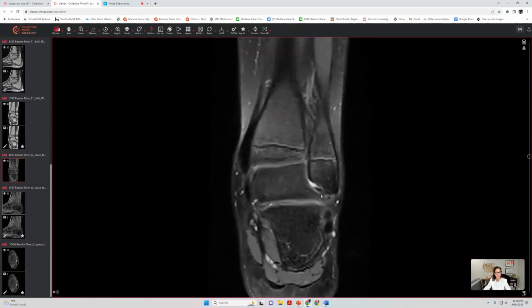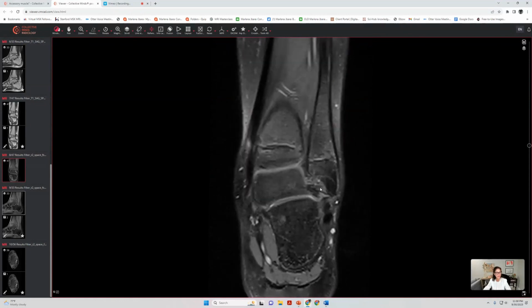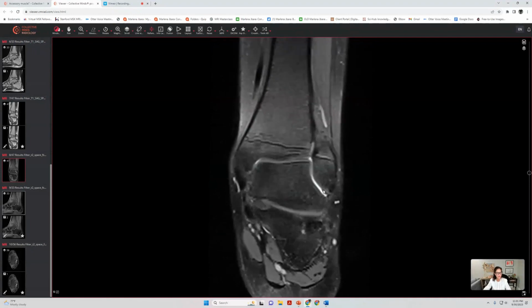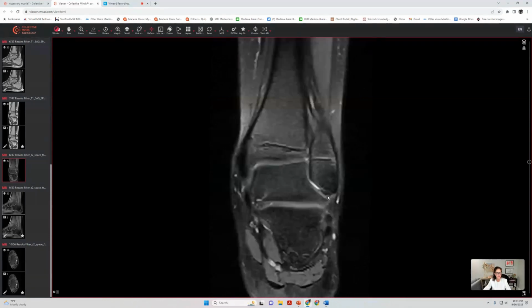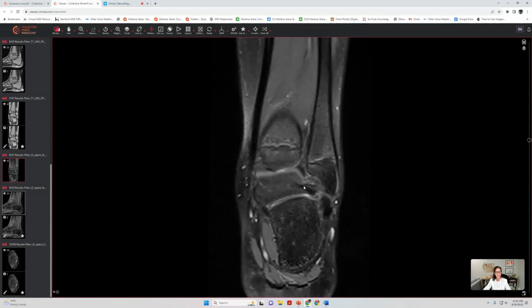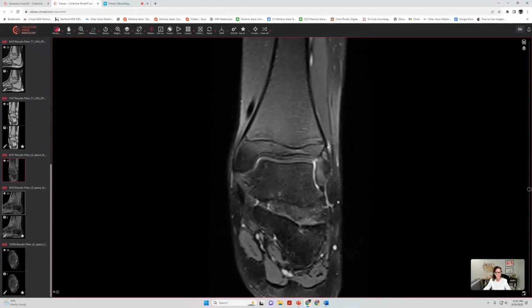Let's move back to the coronal image and take a look at our lateral ankle ligament complex, the ATFL, seen here, to the PTFL. And of course, the ATFL has two bands, the superior band and the inferior band is going to blend with these arcuate ligaments towards that calcaneofibular ligament seen here. This is your calcaneofibular ligament moving from the calcaneus to the fibula, and there is a relationship in these arcuate fibers seen here as we can then attach to our ATFL. So the ATFL, calcaneofibular ligament, PTFL, posterior syndesmosis, interosseous ligament, anterior syndesmosis, several bands to the anterior syndesmosis seen here.